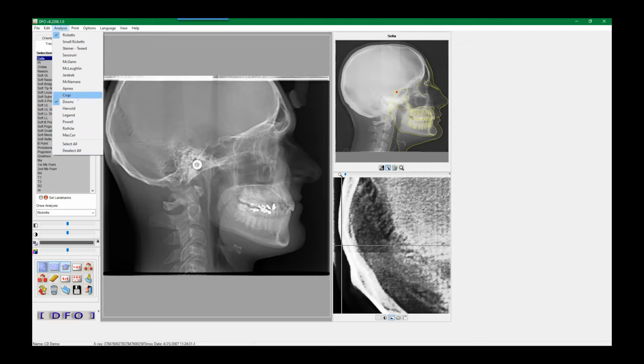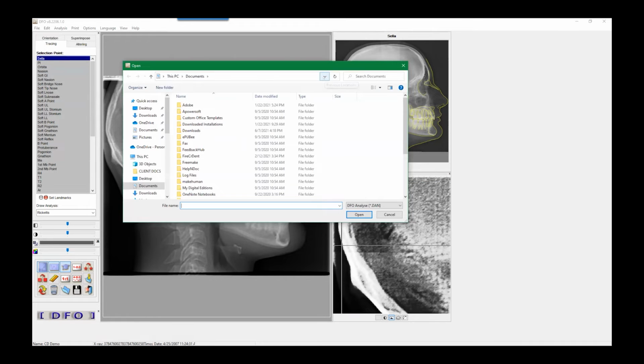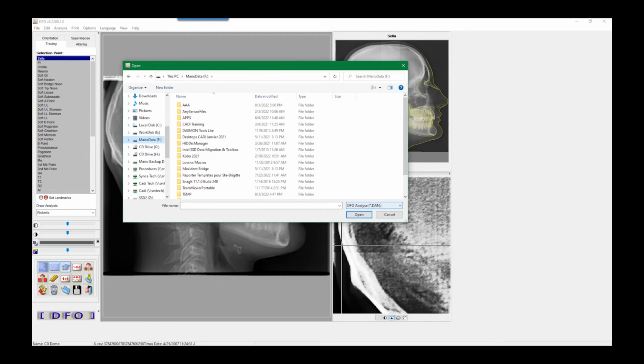When you say import, I'm not the person doing this and I'm barely speaking to the knowledge I have on it, but if we are working in Blue Sky to create our aligners, what is the analysis giving you? Is it telling you the movement of the teeth? Like the phases we're going to go through, it's going to be 2 years, and we're going to do this much movement with this many millimeters. What does that analysis give me? It's really hard to explain. You would need the guy who knows about this.